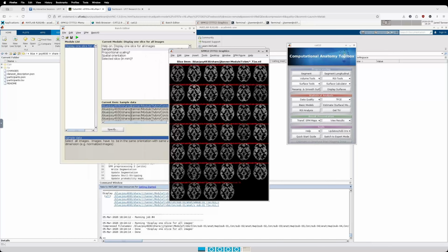So for example, I know it's going to be small, but here, cursor, this is what's called the head of the caudate nucleus. And we see this little separation here between the putamen, that dark bit, that's where white matter would be. That has a little bit of separation. And we can see for pretty much everybody, we have that same structure and a little bit of separation. So the head of the caudate nucleus and this putamen. And that is showing that we have a good registration, or maybe appropriate registration across all of the brains.